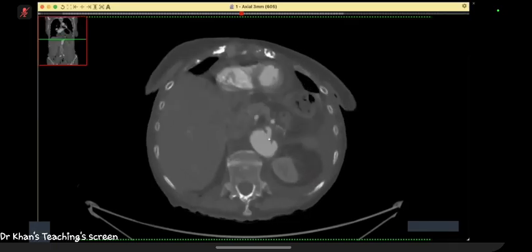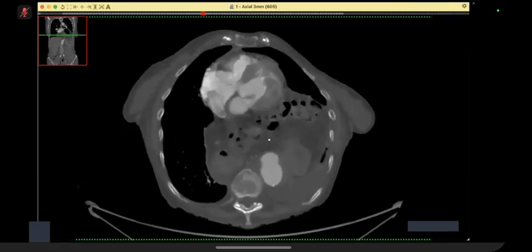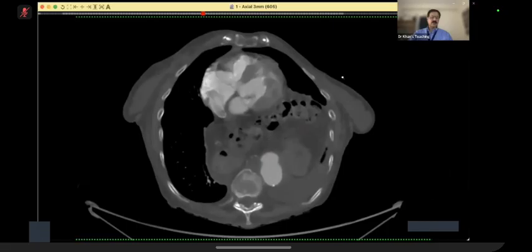So this case has got all three types of pathologies: intramural hematoma, penetrating ulcer, and dissection flaps, which are not full blown, but they are developed. Okay, well done, candidate. But the only thing I wanted you to remember is that you must ask for a non-enhanced. That is the key thing for intramural hematoma.